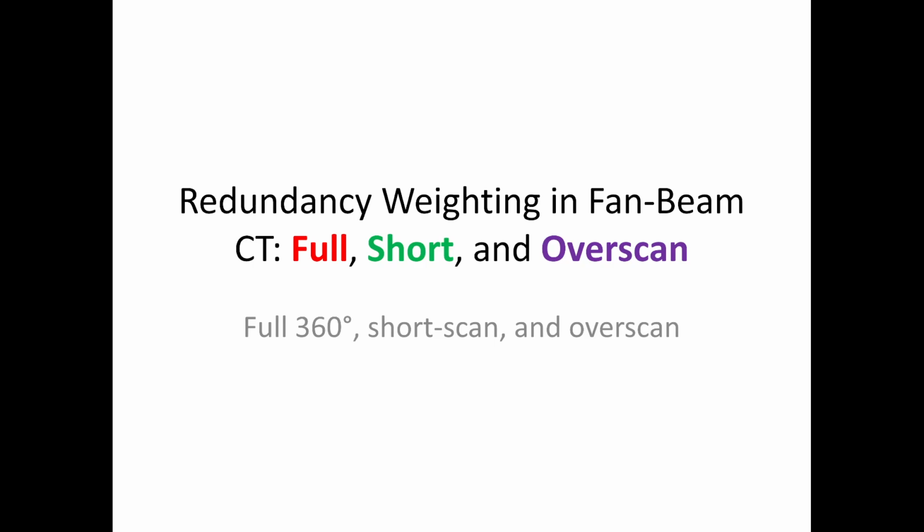In part 1, we generated synthetic projections. In part 2, we reconstructed with filtered backprojection on a full 360 scan. Today in part 3, we are going to compare 3 types of scans: full scan, short scan, and overscan, and see how different redundancy weightings affect the reconstruction.